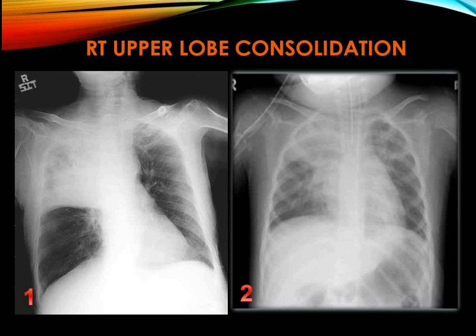This is an example of patchy opacification. هل ناخذ chest X-ray رقم 1. Chest X-ray number 1 shows patchy opacification in the right upper lung zone. Ill-defined opacification, so we are dealing with a patch. The second step: are there any signs of loss of volume؟ اللي هي ممكن تكون deviation of trachea أو elevation of horizontal fissure. Neither of them is present, so we are dealing with patchy opacification without loss of volume, so we are dealing with consolidation.